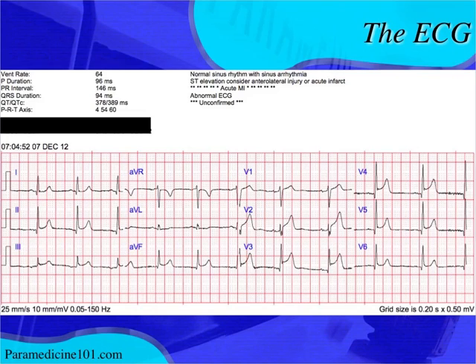So all of these things kind of fit either early repolarization or acute pericarditis. Except this is, in fact, an acute MI. Let me say it again. This is a STEMI. Now, I gave you all those indicators of why it might be acute pericarditis. This degree of ST elevation in V3 actually leans more towards anterior wall MI.